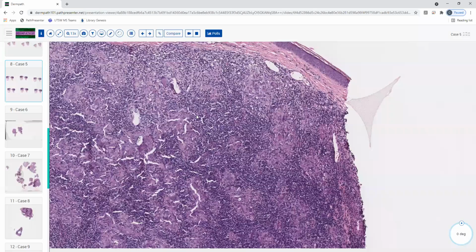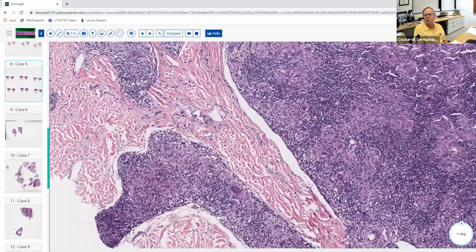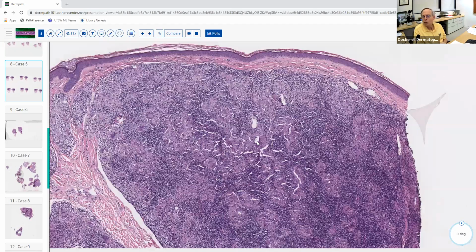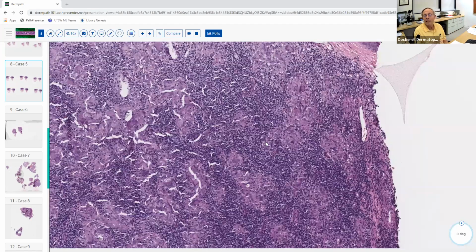So would it be some kind of foreign body, perhaps suture material? It's probably not suture. I'm not sure what this was; it may have been some kind of injury. Patients sometimes get in car wrecks and soil gets implanted in their skin, and they develop sarcoidal granulomatous reactions around that. You can polarize and see the material in there. Sometimes patients get tattoos, and the ink has some foreign material in it, especially prison tattoos. Those very commonly give you a granulomatous foreign body reaction like this.